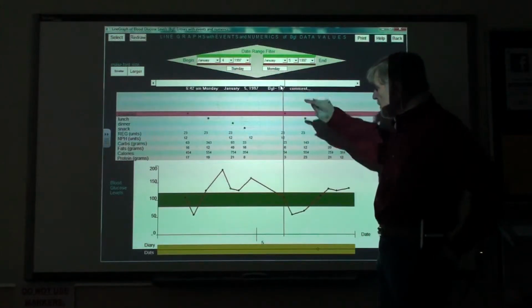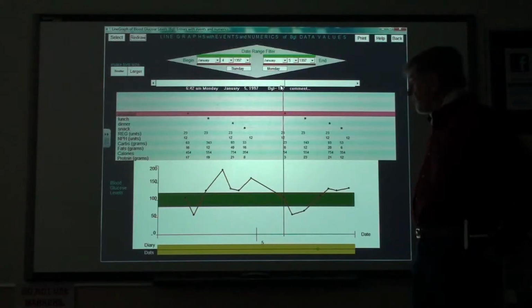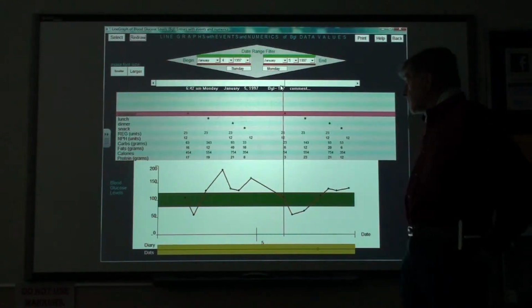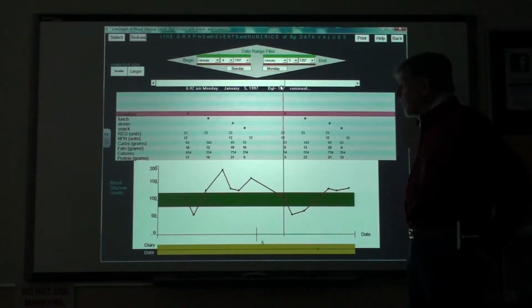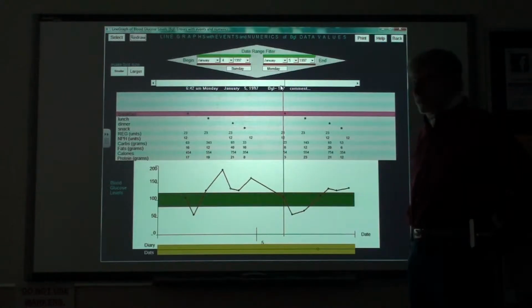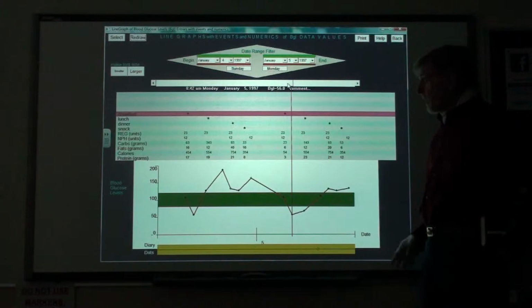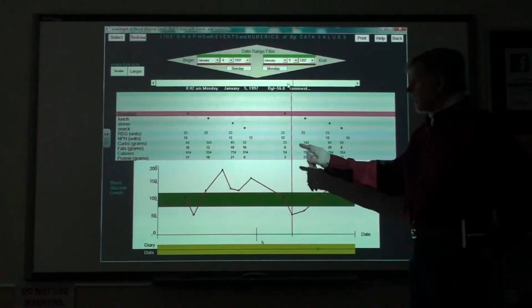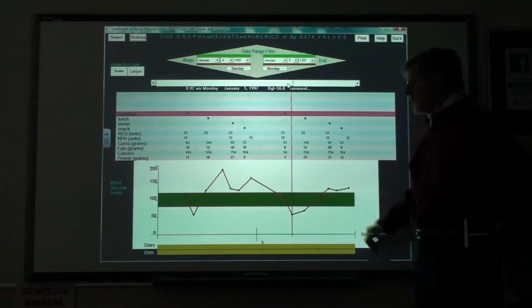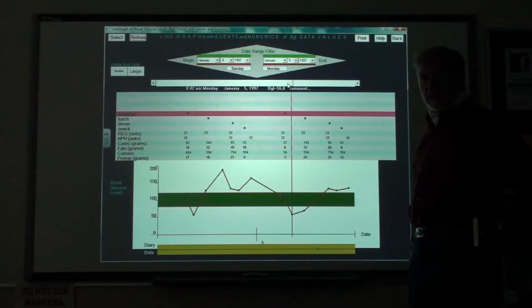If you will observe, this person skipped breakfast. They had 54 calories, 3 grams of protein, and 23 grams of carb for their breakfast. In other words, they basically skipped their breakfast, but they injected their insulin. The insulin continued to act, and it drove them dangerously low. So this graph illustrates clearly the dangers of doing excessive carbohydrates and the dangers of skipping your breakfast. And it will tell you the adjustments to make very clearly.